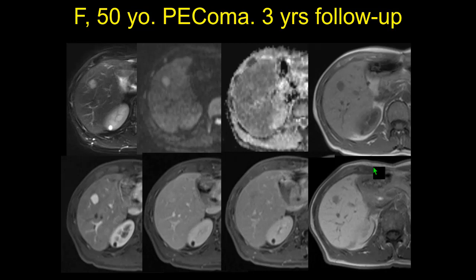At 3 years follow-up, the patient showed a new lesion, and once again not much restricted, to be honest, but bright, very hyper-enhancing, no washout, but if you wait 5 minutes, there was a sort of washout, and it was black on the hepatobiliary phase. Biopsy: PEComa.